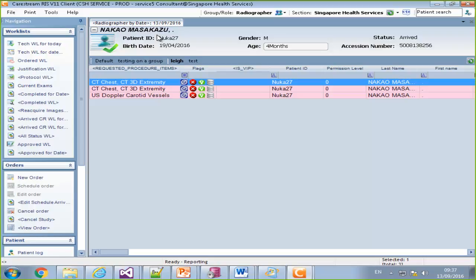Okay, hi, I'm Dina, and this is Talor. We both developed the documentation together, multiple studies documentation feature, and now we're going to demonstrate it.